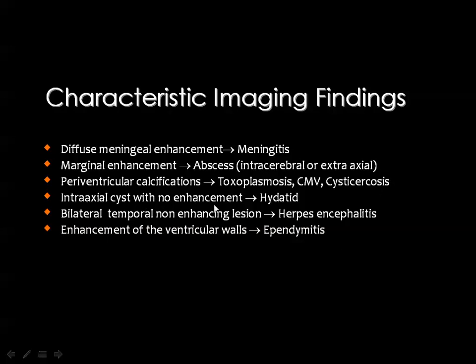Intraaxial cyst with no enhancement is usually diagnostic of hydatid cyst. Bilateral temporal non-enhancing lesions are highly suggestive of herpes encephalitis whenever the clinical picture can allow this diagnosis, and enhancement of the ventricular wall is diagnostic of ependymitis.